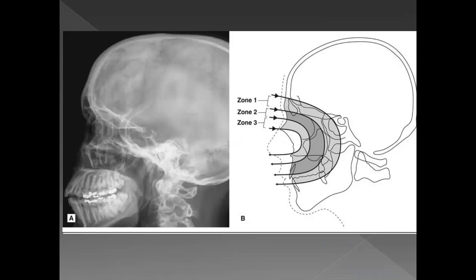So how do you interpret this X-ray? Well, there is a zone type classification given for these lateral skull type of X-rays, which is not something I would expect us surgeons to remember, because it's quite complicated. But still, here we'll give it a try.